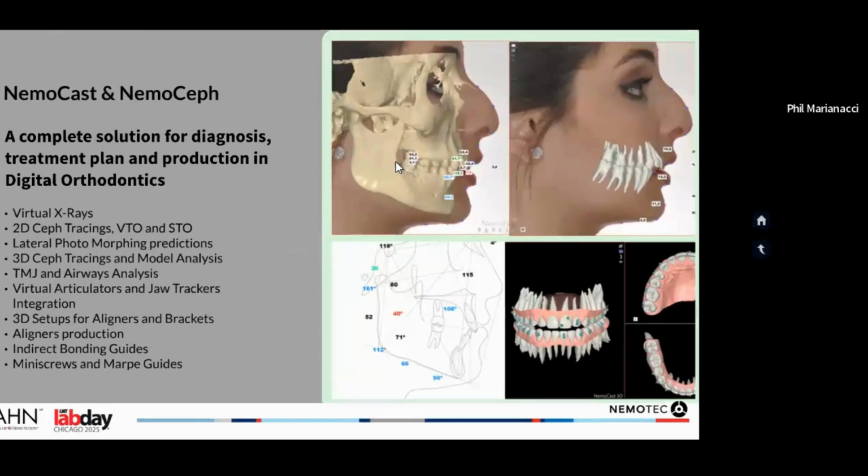This is something that I don't claim to be an expert in by any means whatsoever. Ortho is not my side of things. But it does have orthodontic treatment planning, where you can do aligners and airway options, and we do have a few of our orthodontists that are part of a couple of different study clubs. They are using these functions in the group.